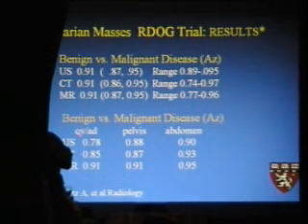Once we start spreading outside the ovary, looking for staging, it's surprisingly MRI, even in those days, which is now, I don't know how long ago this was, it's too long to count probably, but MRI was doing very well, a little bit better than CT here, because I think MRI had the advantage of multiplanar imaging and was able to see the diaphragm better, so picking up peritoneal implants in that area was an advantage for MRI.